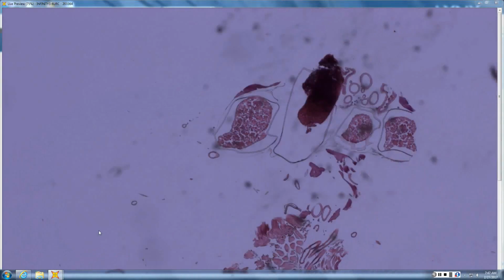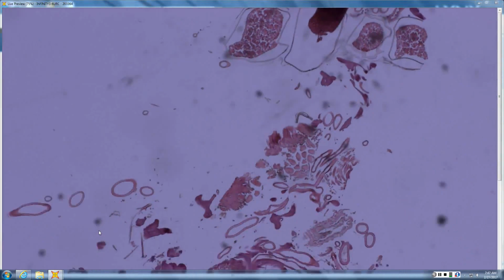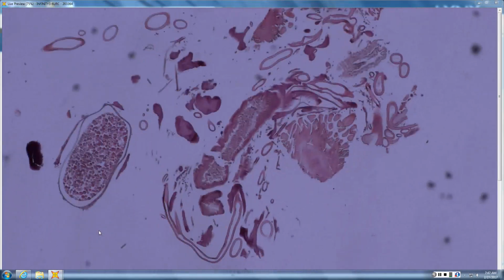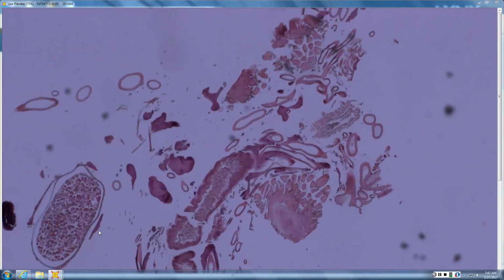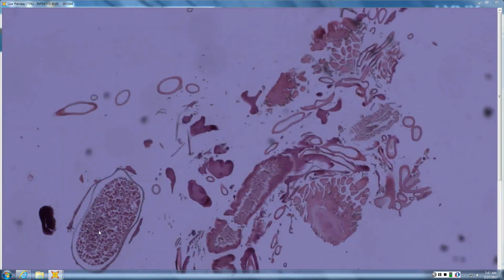Okay. This is someone who came back from the Caribbean on vacation and had a black lesion next to the toenail, and their family doctor said, boy, I'm worried about melanoma, and they punched out that little black lesion next to the great toenail.